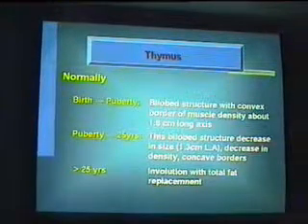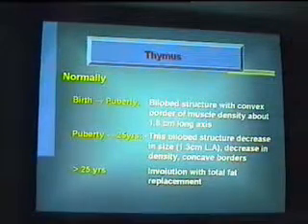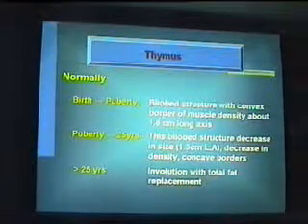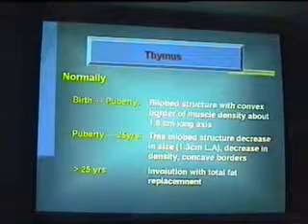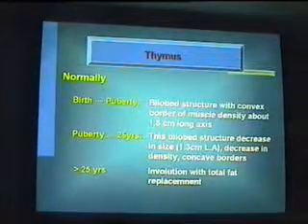It is well defined with a convex lobulated outline، وبيبقى طولها حوالي 1.8 سنتيمتر، يعني برضو لها حجم. والدنسيتي بتاعتها بتبقى muscle density. It's a soft tissue density. يبقى تاني from birth to puberty تبقى bilobe convex border of muscle density about 1.8 centimeters in long axis.